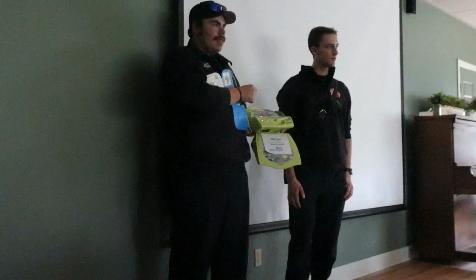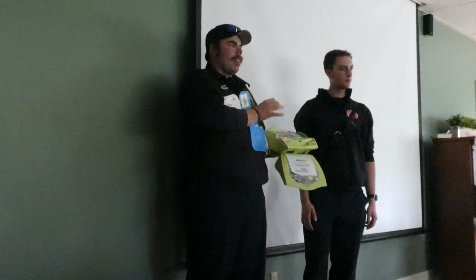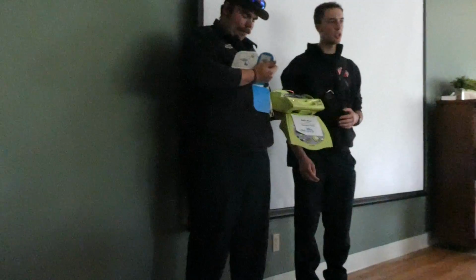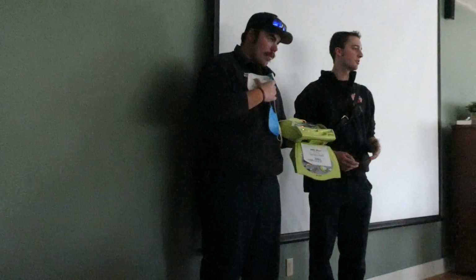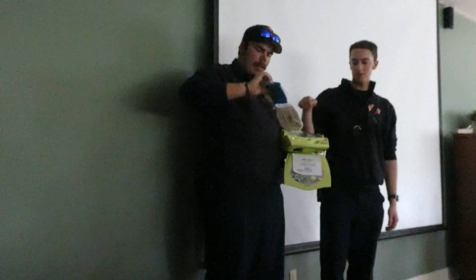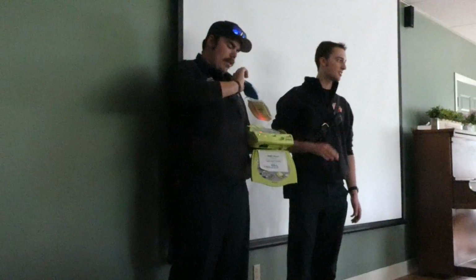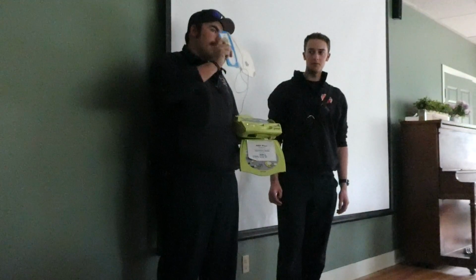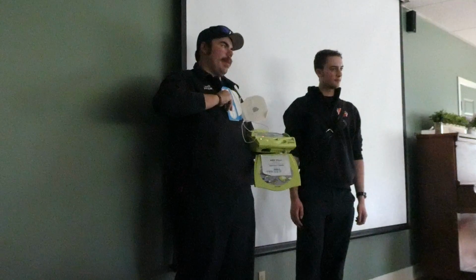And then it'll deliver the shock, and then it'll tell you to start CPR, and it'll even beep. It'll beep about 100 times every minute, and when you're doing CPR, you're supposed to compress the person's chest every time it beeps. So it's just a metronome to help keep you on the right pace. Awesome. And there are pictures inside here that show you exactly what you're supposed to do. There are pictures on the pads, and where the cross is on the pad, that goes right over where their heart is going to be, and that's right where you do the CPR.